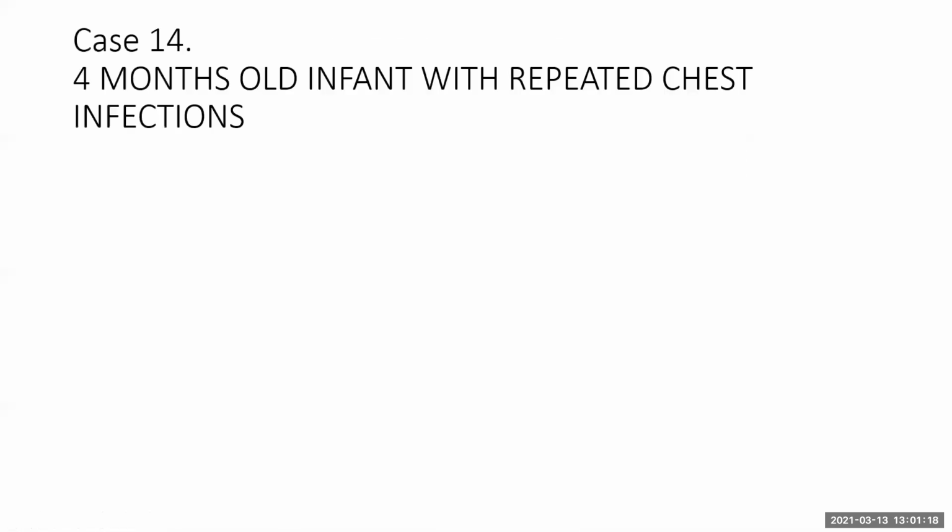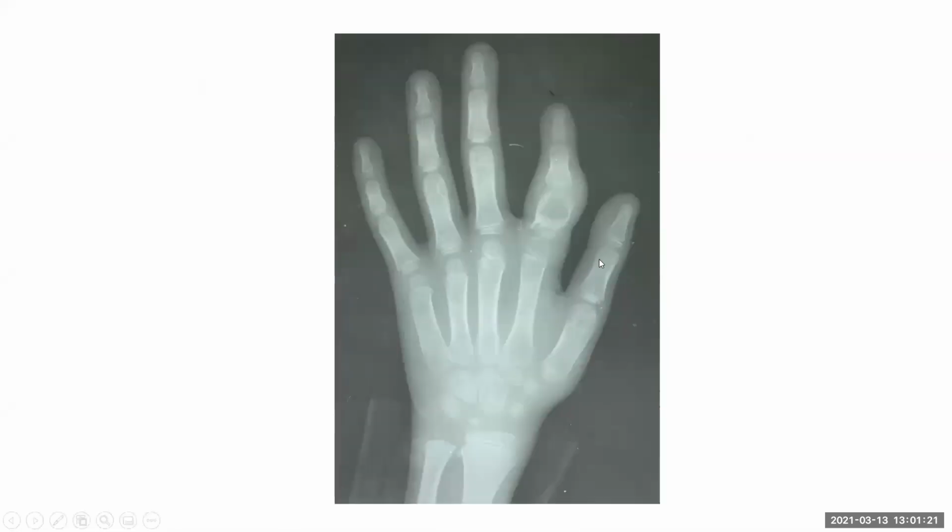Okay, thank you. And very rightly said, tuberculous dactylitis or spina ventosa, it was called. And once upon a time, syphilis was a differential, because that also had a similar appearance. Yes, LCH it can be, but metastasis is a bit rare below the elbow. That is what our teachers used to tell us long time ago, that metastases below the elbow are rare. It does happen, I'm not saying it doesn't, but they are rare.